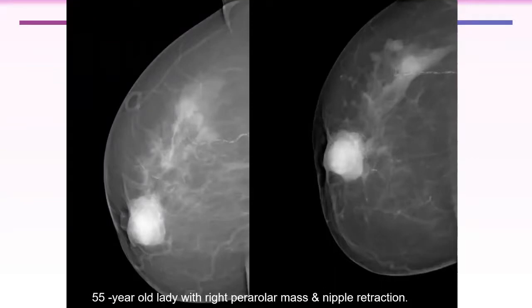Fibrocystic disease. Okay. Maybe. But if you have a suspicious mass and you have other nodules, you have to think about multifocal and multicentric disease. Yes. You have to think about this first. Since the index mass is suspicious, you have to think about excluding multifocal disease. Suspiciously. Okay.